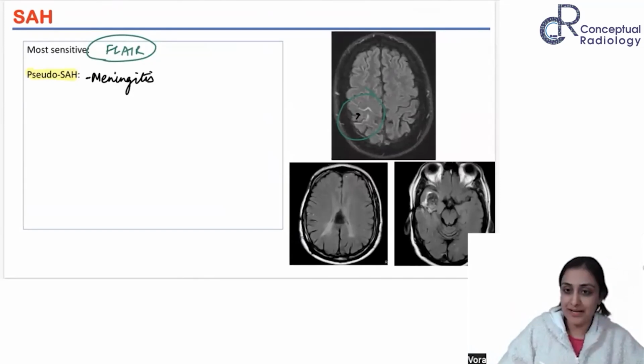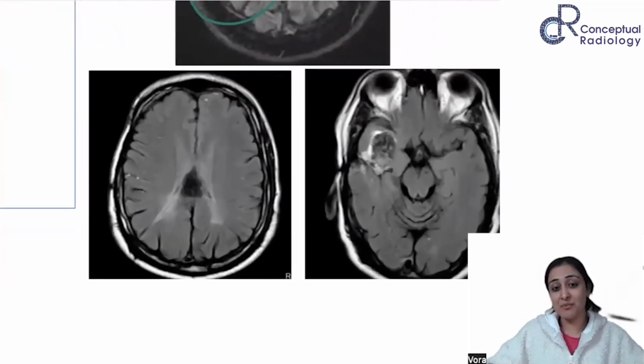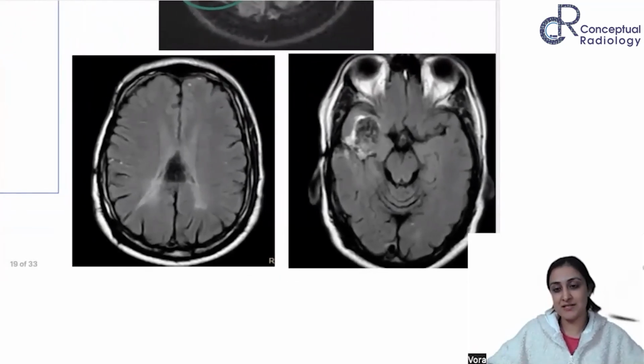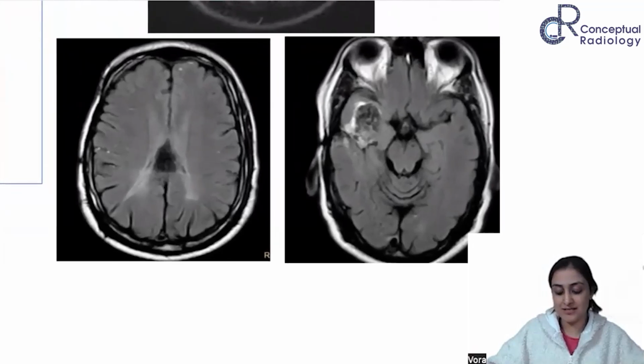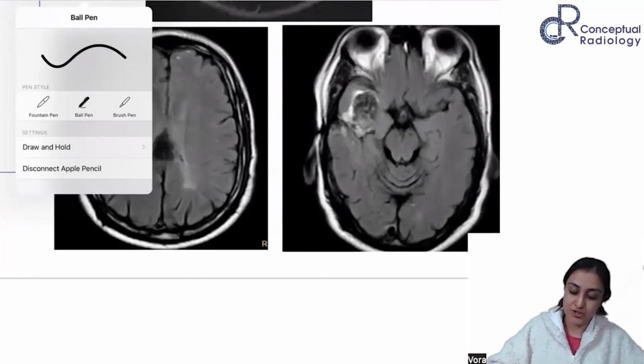Meningitis can have this flare hyperintensity. What you've actually said as ruptured dermoid, I wanted to show you this as a spotter. Can you look at these two cases and tell me the diagnosis? Again, comes as a spotter in lots of quizzes.